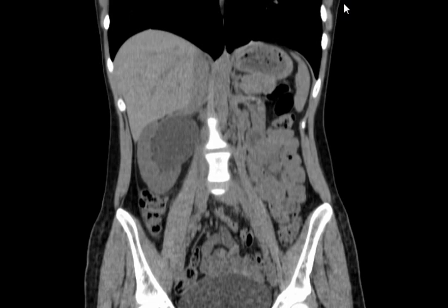But with stenosis the kidney is still functioning and the cortex is still thick. How do you tell? First by age. Second, you give contrast and take a very delayed image, like after half an hour. If you see contrast in the ureter, then this is stenosis.